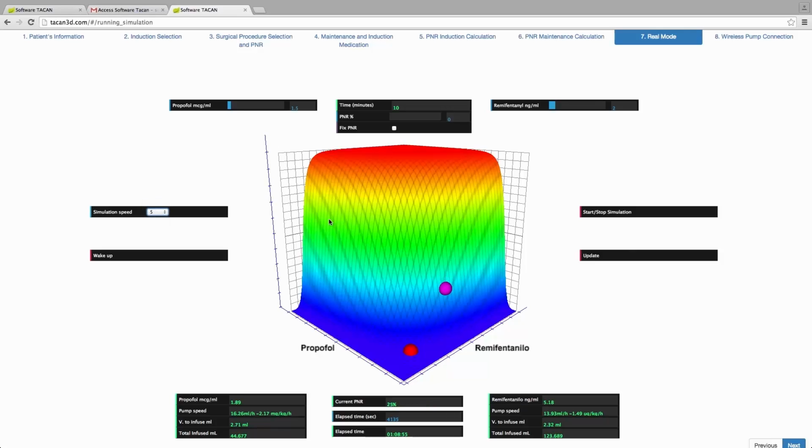TACAN 3D is a futuristic software since it can collect the navigation coordinates of the anesthesiologist for the different surgeries and map the spectrum sector where they are navigating. This would allow recommending more precise starting coordinates for students or anesthesiologists who wish to enter the total intravenous anesthesia.